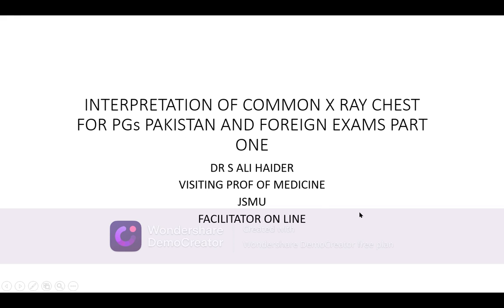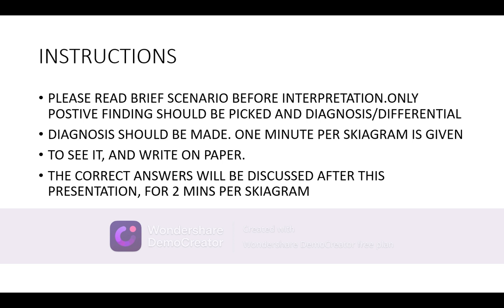This is part 1. I will show you 10 plain chest X-rays. Take your time. Please read the brief scenario before the interpretation. Only positive findings should be picked, and a diagnosis and differential diagnosis should be made. One minute per X-ray is given to see it and write on the paper.